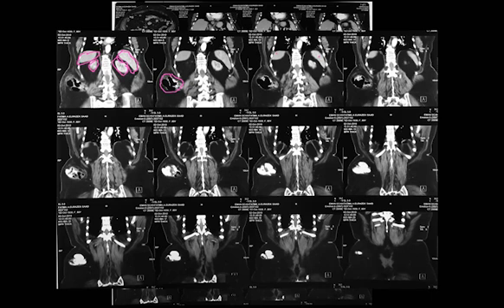Do you think this is the inguinal region? Do you really think this is it? احنا at the back. ده احنا رجعنا ورا خالص. اوكي. يبقى what could it be؟ لو كان قدام بس ده very posterior. يبقى ايه؟ Lumbar. Absolutely. يبقى it could be another lumbar hernia.